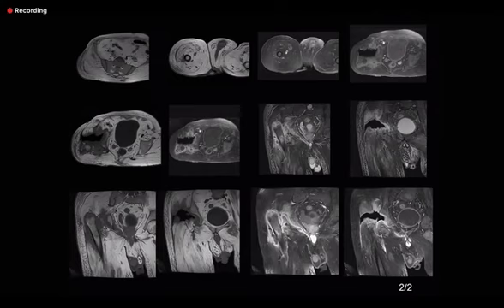The word phlegmon versus an abscess. And this concept is very important. And in the spine, they will ask you in the exam cases, why? Because it becomes a very important concept in your clinical context. Anywhere where there is inflammation, there will be enhancement. Just remember it like this, that this is enhancing inflammatory tissue. And at that point, there is no pus formation. When there is pus formation, then there is an abscess, which is liquefied. Pus will not enhance. So pus will become drainable.